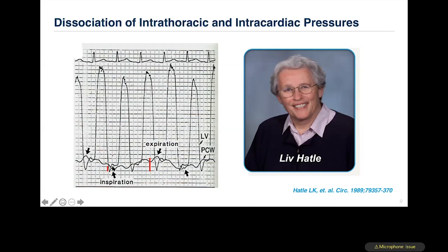But the intracardiac LV pressure is not falling down simultaneously. So you see, therefore, there is a gradient. There is some kind of a walling mechanism.